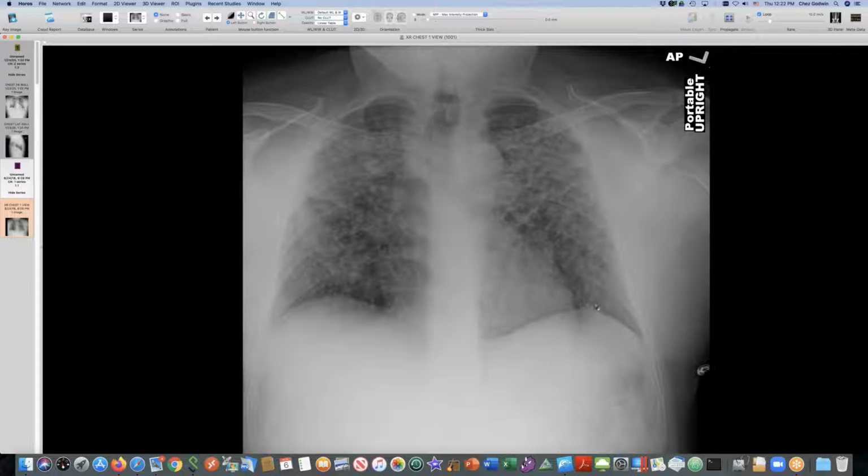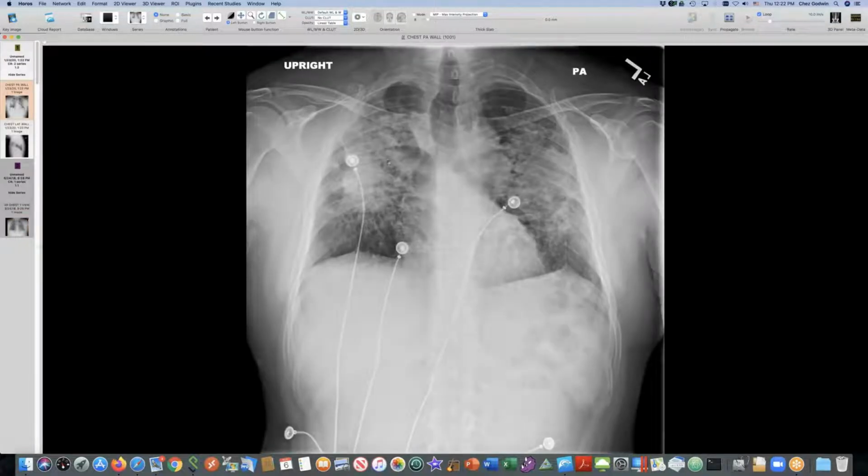We're generating a juxtaphrenic peak down here because of upper lung volume loss. So this is over the course of about a year. This is 2018. And then here's his current radiograph, which just showed up and which caused me to want to show you this case again.